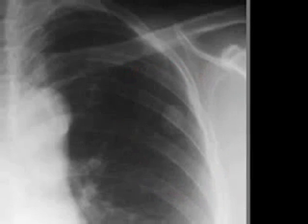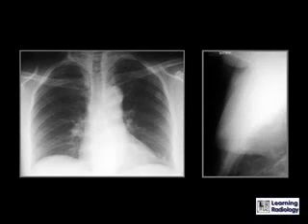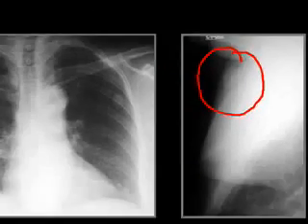Well, hopefully you were able to see a nodule in the left upper lobe of this patient, or at least superimposed on the left upper lobe of this patient, and hopefully you said that the next image that you would obtain would be a lateral view, which is a close-up we're showing you of a lateral here, and if you look very carefully, there is a lesion that is projecting outside of the chest on the patient's skin on the lateral view.